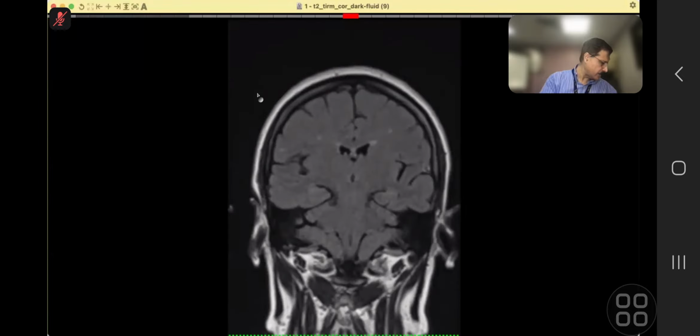Yes sir, this is your second last case of the day. MR brain, 66-year-old, TIA clinic, visual disturbances. So the patient presented for TIA clinic, and on the DWI sequence, there was no abnormality.